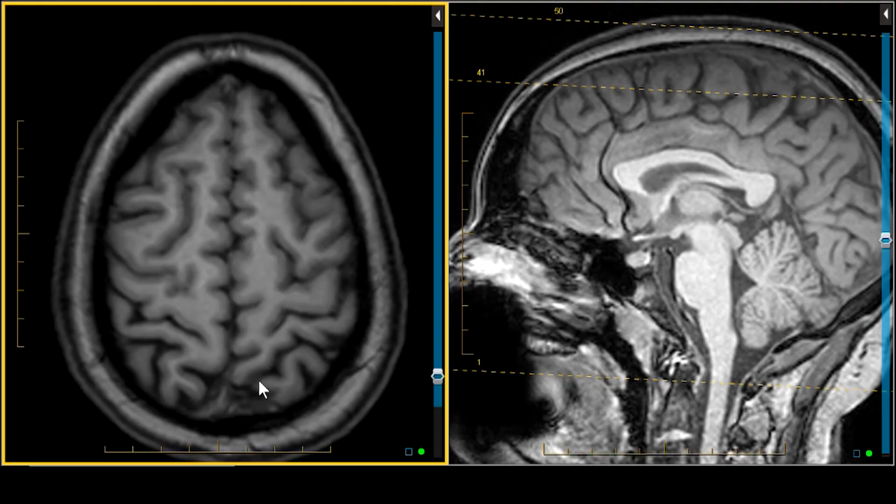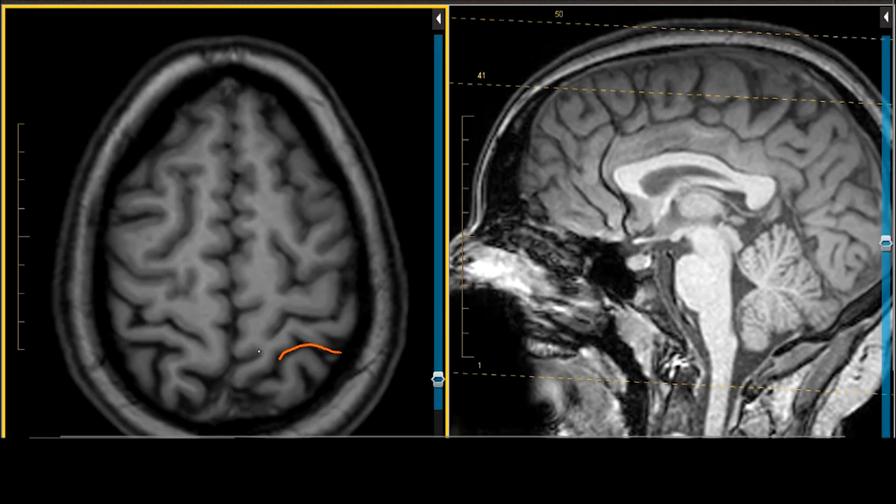You all know from prior vignettes, if you've watched them, that the post-central sulcus is the upswing of the arcuate-shaped intraparietal sulcus. So we've got post-central sulcus, precentral sulcus, precentral gyrus, post-central gyrus, hand motor area, pars marginalis. And the pars marginalis looks a little bit different on MR than CT for reasons previously discussed.